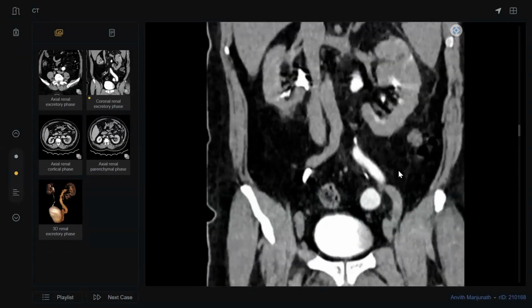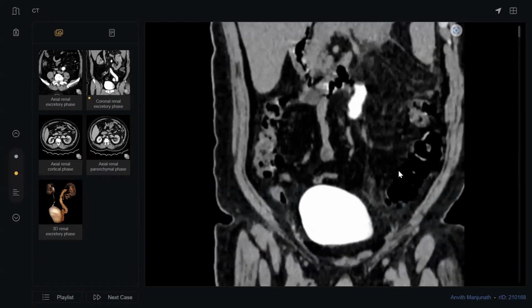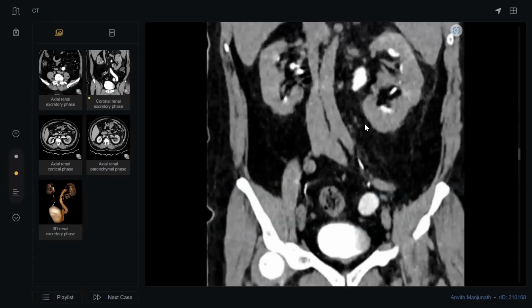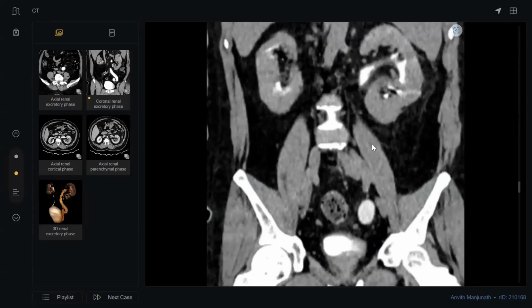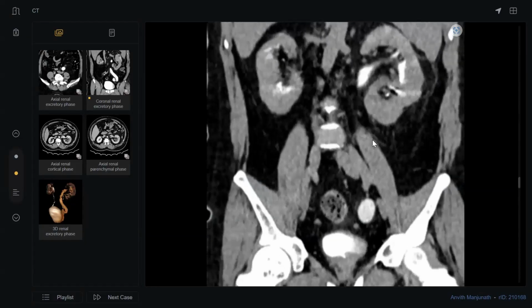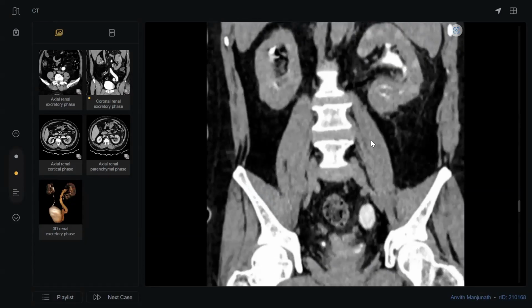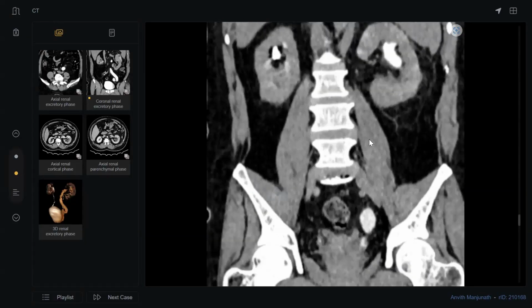With dilatation, the ureter appears dilated. I'm looking for any filling defects within. I could not appreciate any filling defect. I'm looking for any duplex collecting system. Yes, I can see a duplex collecting system with the lower pole not dilated. So this might be associated with bilateral, there is bilateral association. So I am ruling out. I'm sorry, sir, I'm not able to scroll well. Leave the mouse, I will scroll.